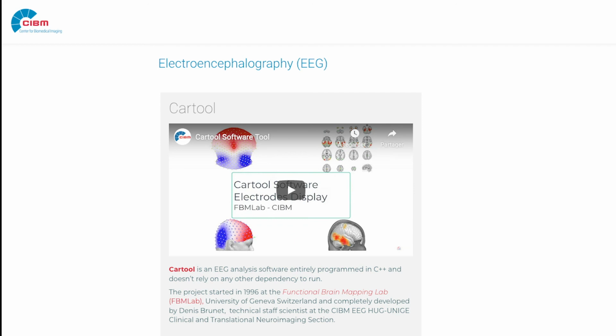So you mean really on the surface of the white matter? Of the gray matter? Of the white matter, yeah, I think. I think that's what they're using mostly in the mainstream pipeline. So you say on the surface of the white matter? Yes, I think that's the default. But it still follows the surface of the brain. Okay, yes, I see.